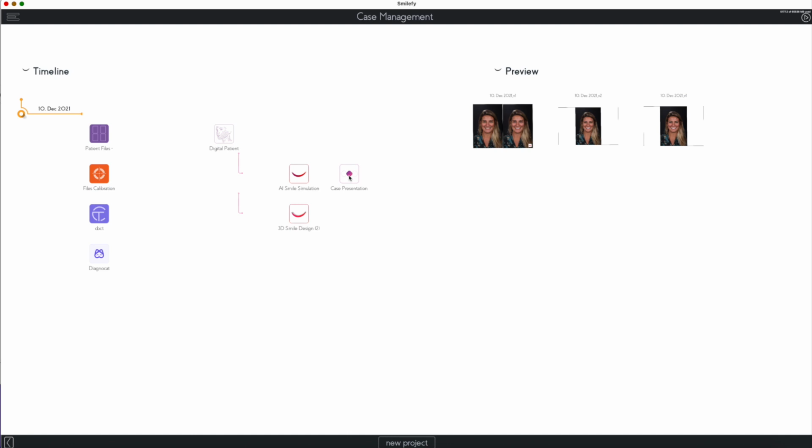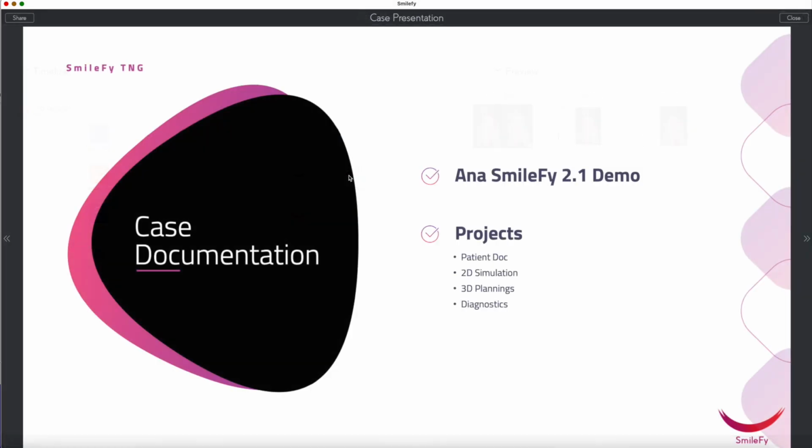Now, with one click, we can open the case presentation and review the case.